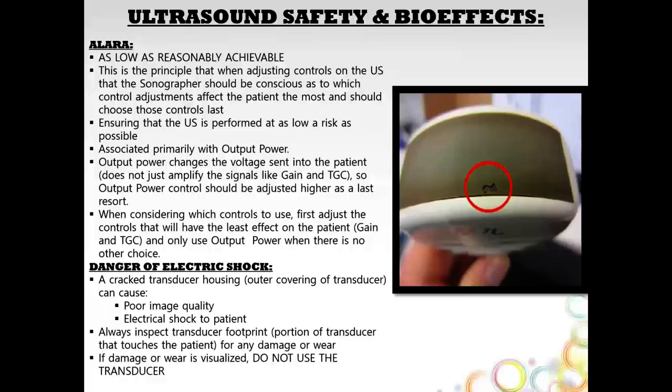And then we also want to pay attention to the danger of electric shock. If you have a cracked outer portion of your transducer, if your outer transducer ever looks like that, do not place it on the patient. And every morning when you start scanning, you should look at your transducer to make sure that there's no cracks or holes in that transducer housing or outer covering of the transducer, because it can deliver a deadly electric shock to the patient. You can kill a patient with this. So if you notice any wear or tear or crack or damage in that transducer, please do not use that transducer.